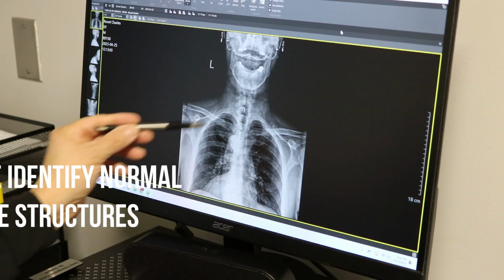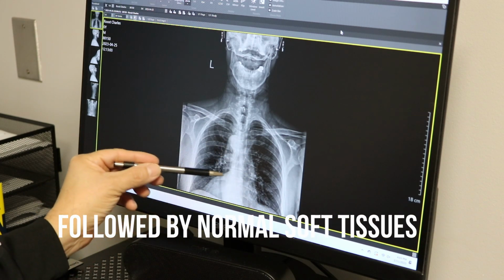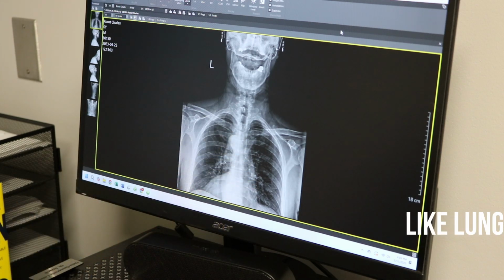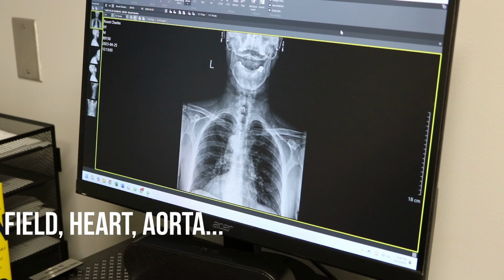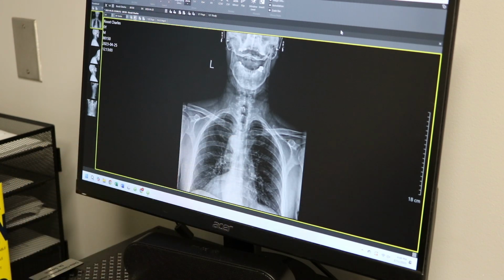We've got the lung fields right here, like so. Then we have the heart overlapping right here, and this little speckled effect that shows up through here would be soft tissue in the lungs or even lymph tissue. How about the aorta? Where's the aorta in there? That would be right here. So it comes up out of the heart, turns over and heads back down the chest.